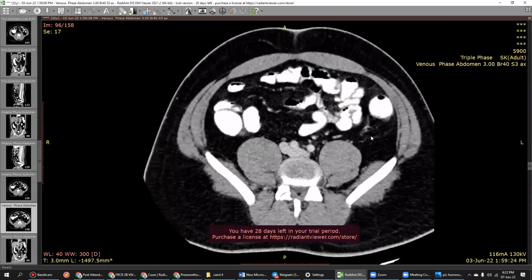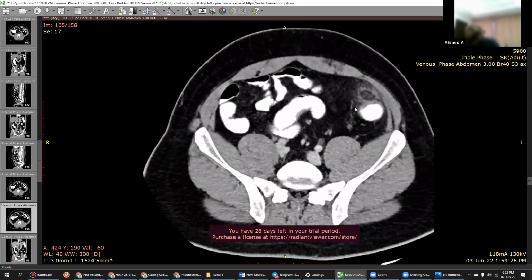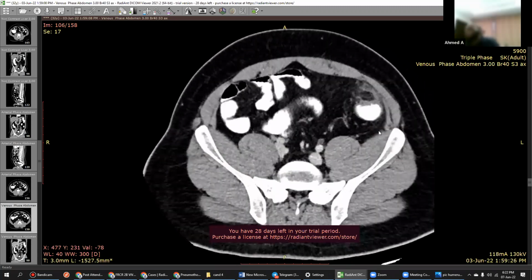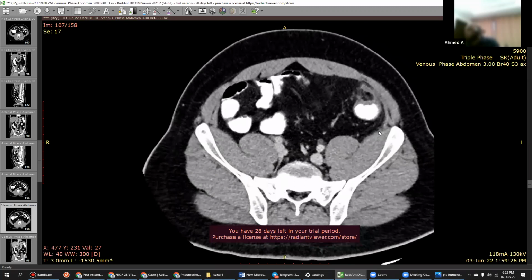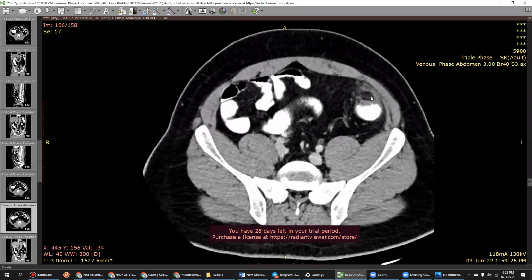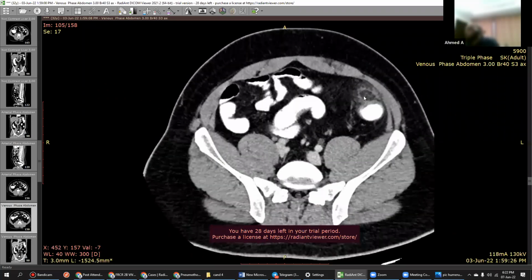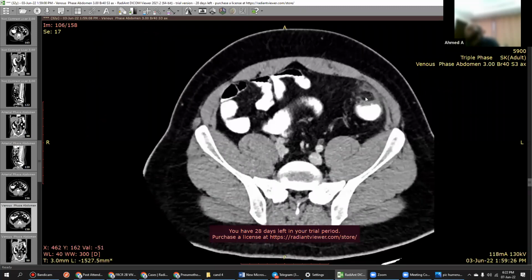I'm just telling you in between so that you don't forget. Here, you know what is the cause of epiploic appendicitis? Any idea? Torsion of the epiploic appendage of the colon. Torsion, and the vessel which is supplying that epiploic appendage gets thrombosed. You can see here this density inside. This is the vessel, this thin string-like thing you can see, right? That's the vessel that gets thrombosed. That is very classic of epiploic appendicitis.